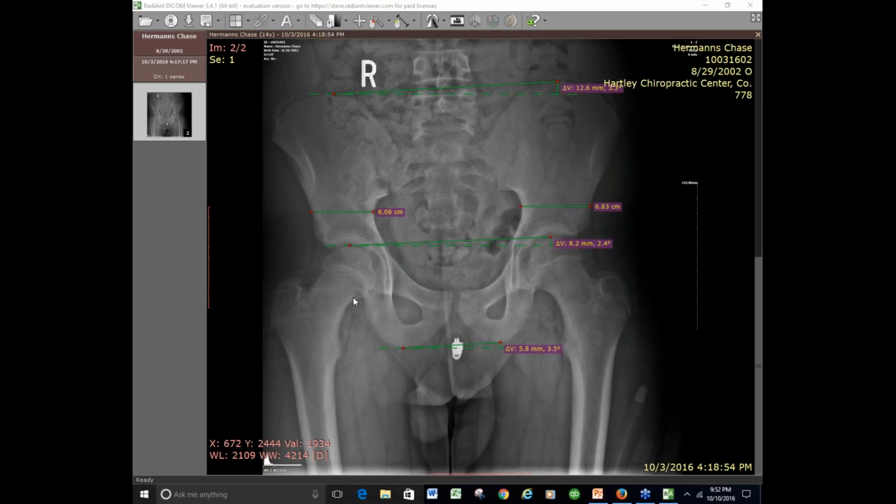Because the whole film starts out as white, right? The reason that zipper is so white, right there in the middle, is because the metal completely blocked the X-rays. So you're looking at a white shadow. The whole film starts out white and turns dark where the X-rays hit it.